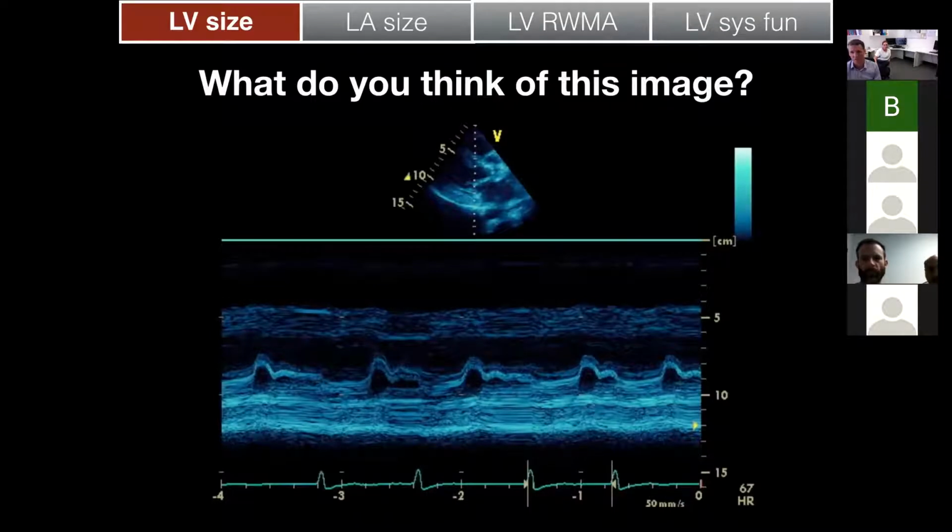So where are we up to next? Bijeth, do you want to kick off with this? I'll just unmute you. Bijeth, what do you think of this image?